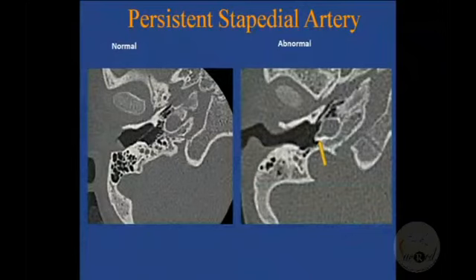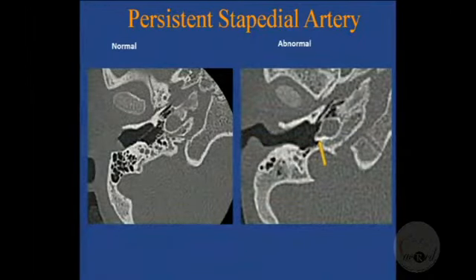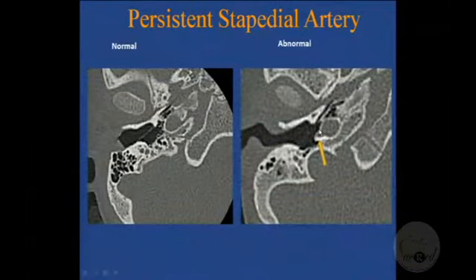I missed this finding on one cut. How do I pick that up on a different image or a different sequence? That's how you need to approach it. So chances are, if you're looking for it, you won't miss it. But if you're not looking for it, chances are that if it's only on one cut, you'll miss it. Then you might see it still, or you might miss it.